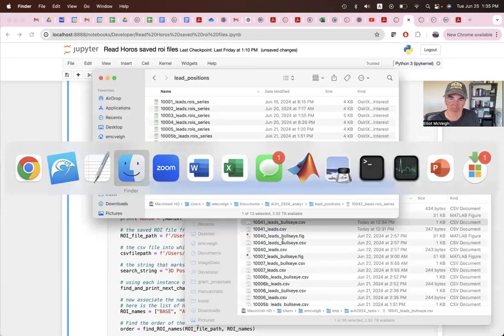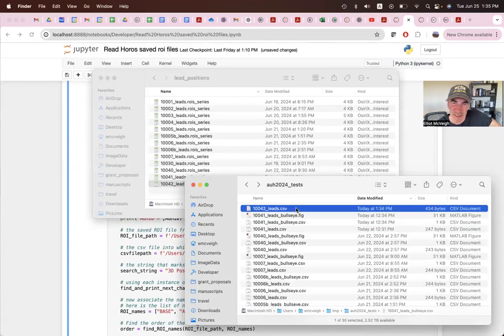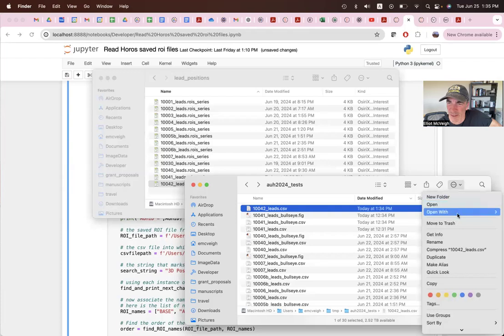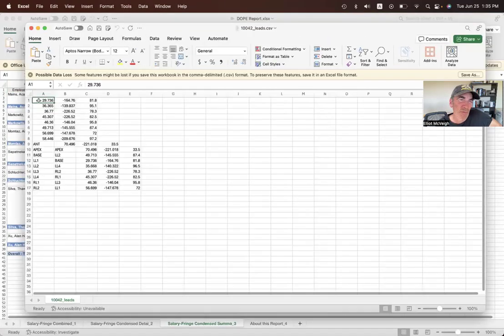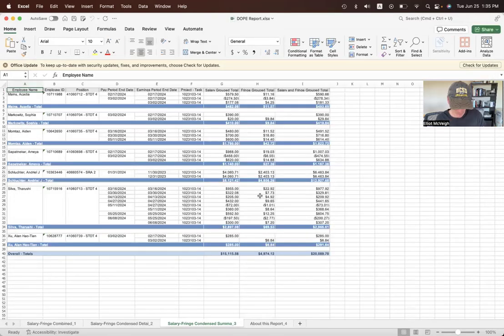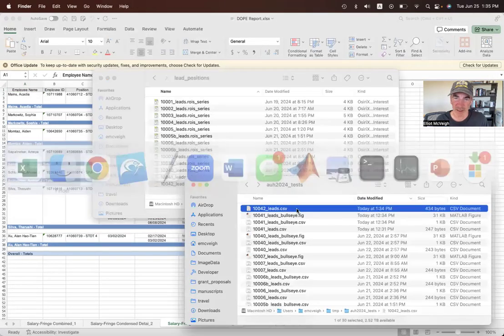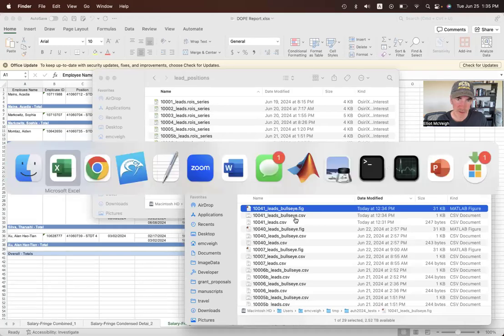And this program wrote out an Excel file or a CSV file, and it looks something like this. Unfortunately, it's locked CSV. And if we look at it with Excel, let's see what's in there. Oh, this is what the file is supposed to look like here, but shoot, I forgot. I've got to delete this because Excel opened it and wrote stuff into it in addition. So we've got to delete that.